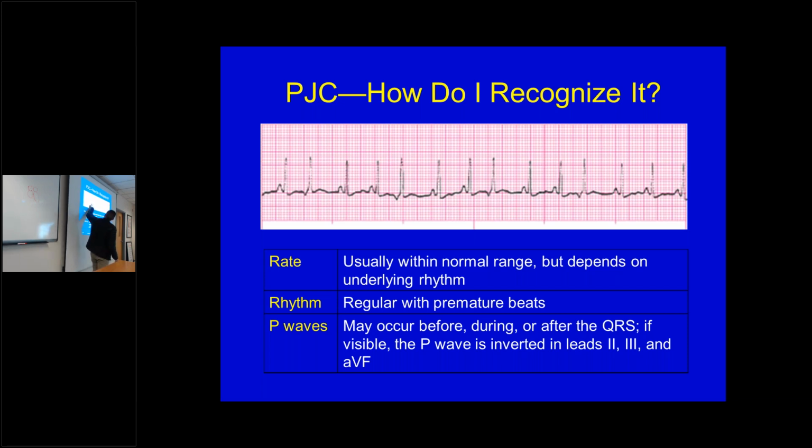That wouldn't have been an inverted P wave? It could be, but we just don't know. It looks like it's probably within the QRS complex. That might be an inverted P wave mixed in. It doesn't look like it normally has the Q wave. So yeah, you can call that an inverted P wave before. Then you got P wave, and then another one. P wave, another one. P wave, another one.